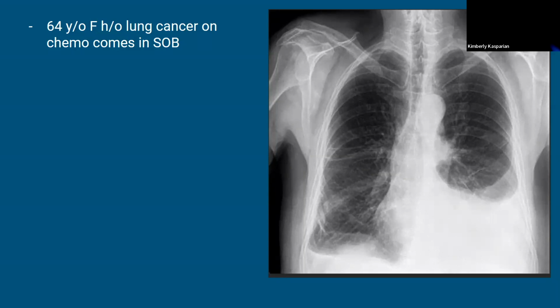Airways, midline. Bones, I don't really see anything. It's a little bit underpenetrated. Yeah, it's kind of not the greatest quality. It's also interfered with by the large effusion. Diaphragm: on the right side, it looks a little blunted, maybe a small pleural effusion, but the left side definitely is large.